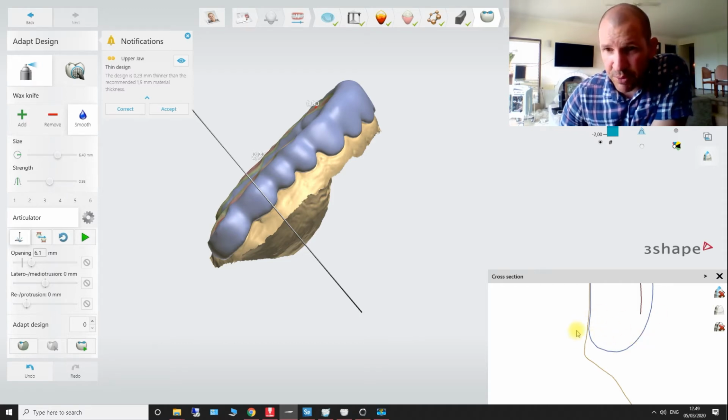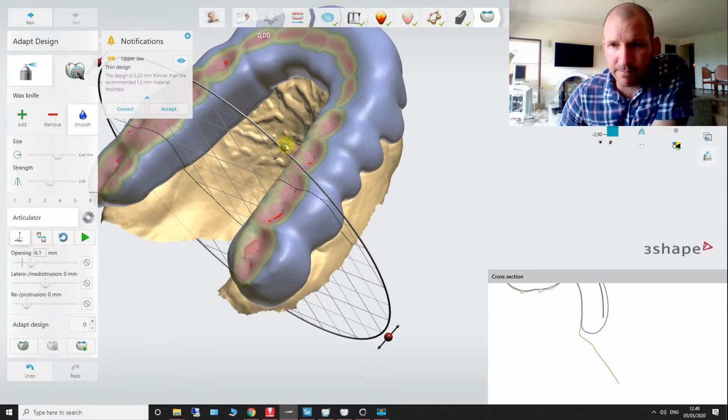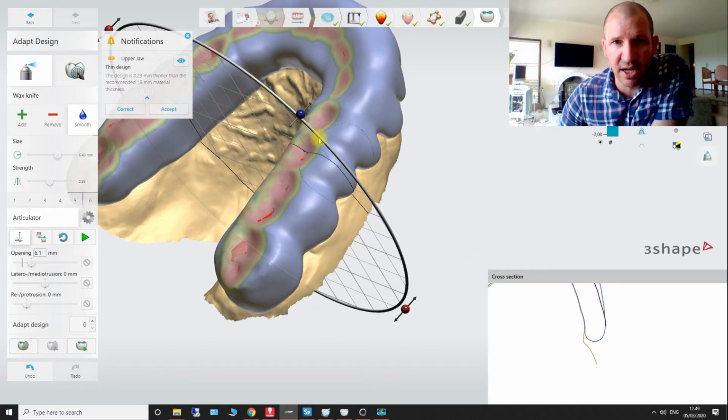Because it's a wider surface, it starts to come across faster. If you choose 1.5, it's going to be able to come down a little bit more to join up there. So the wider you make it, the thicker you make it, the higher up this point is going to be, if that makes any sense. So after we've done this design, we just go through our model and we make sure that we're engaging in the undercuts the whole way through.